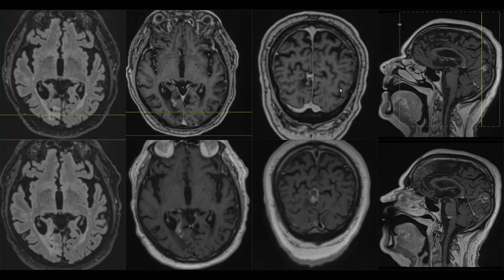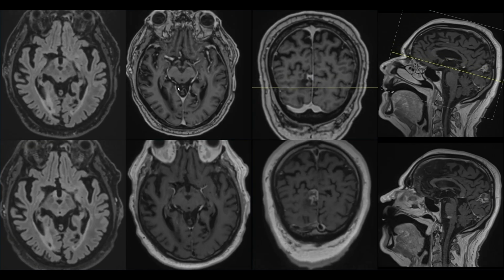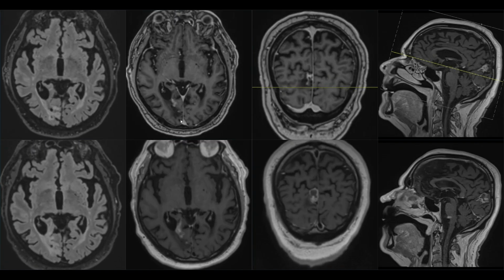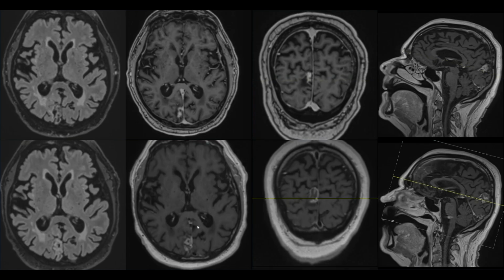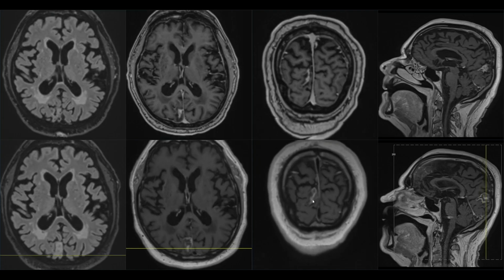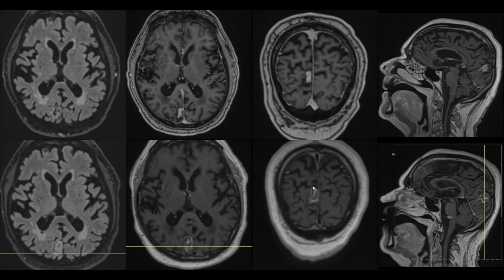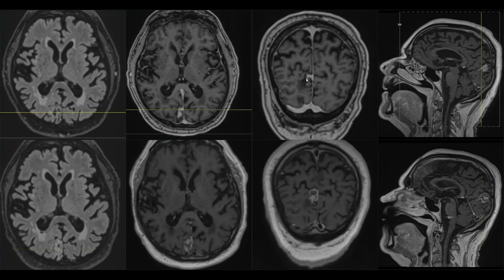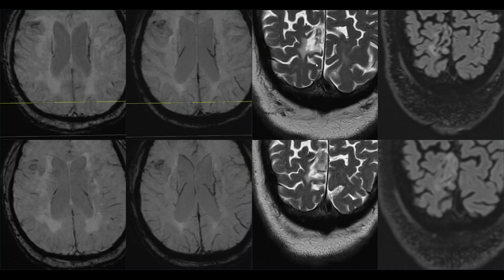With the follow-up exam 5 months later, we can still see the contrast enhancing areas occipitally, but the volume of these areas, as you can see, has diminished. You can also see here that there was a little bit of fluid because of necrosis of this tissue, and this is resorbed. Only the contrast enhancing areas remain.